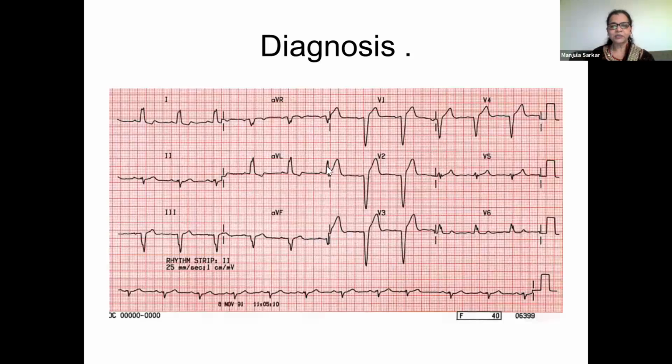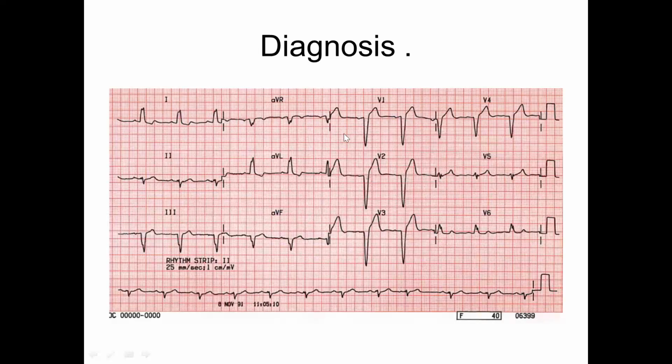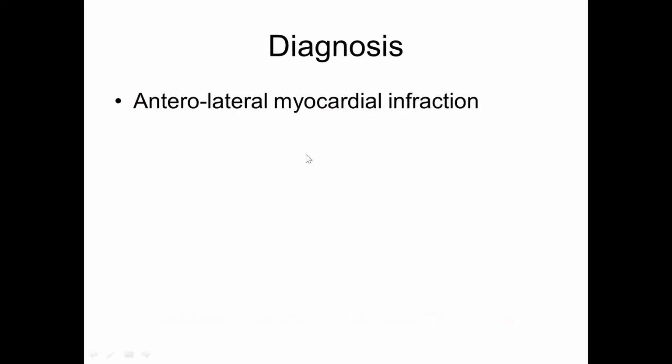Now, what is this? LBBB. LBBB, ma'am. Left ventricle. Anterolateral myocardial infarct with LBBB.